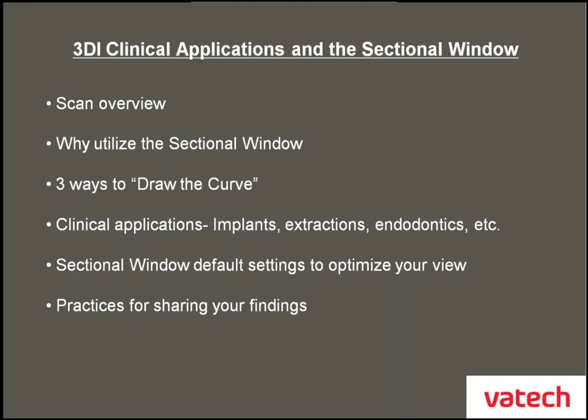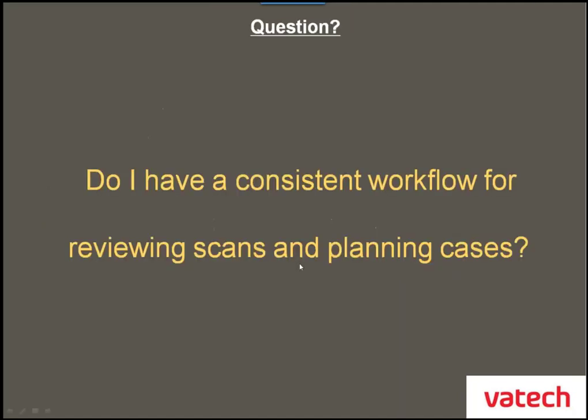Sectional window defaults: we're going to give you the tools to set your defaults on your sectional window to optimize the view that you want to see. And then also some practices for sharing your findings, be it photos, emails, etc. So Paul, I think we're almost ready to start.